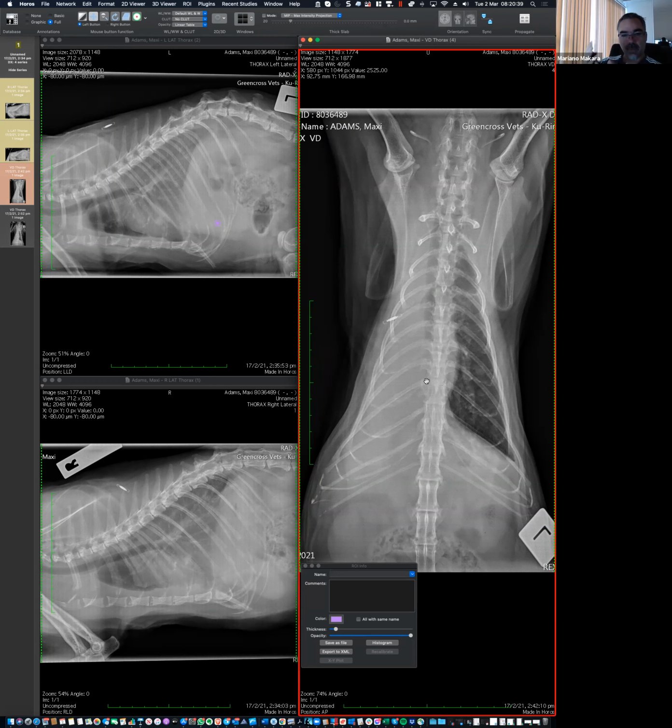Make sense? So if we play with the hypothesis of that being lung, then in my eyes we can have a bit of pleural effusion. I have no issue with that. If the lung is very severely affected, there may be pleural effusion. But because the primary mechanism is going to be the lung, all that right lung being affected, then we can explain why we don't see any lung border, any separation of the lung from the wall.